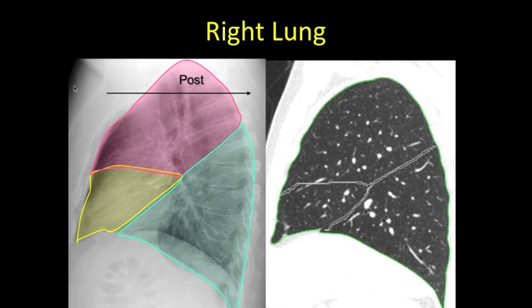This lateral radiograph shows the level of the clavicles and shows how the apex of the lung arcs more posteriorly and in the mid-thorax as opposed to anteriorly.